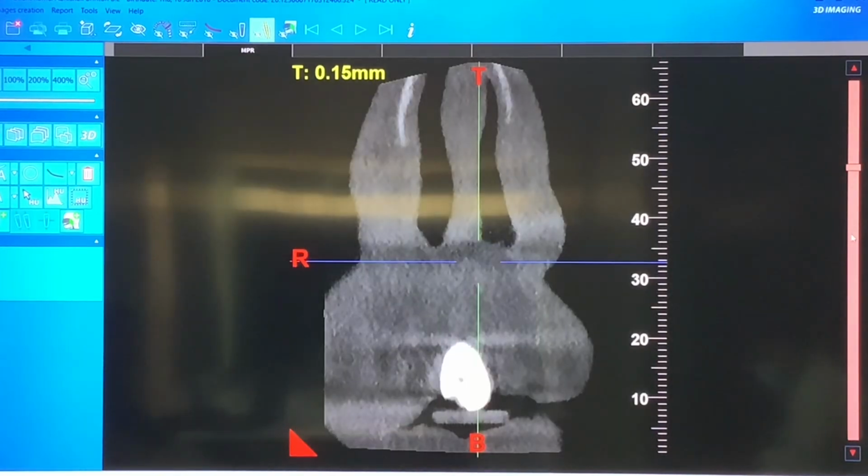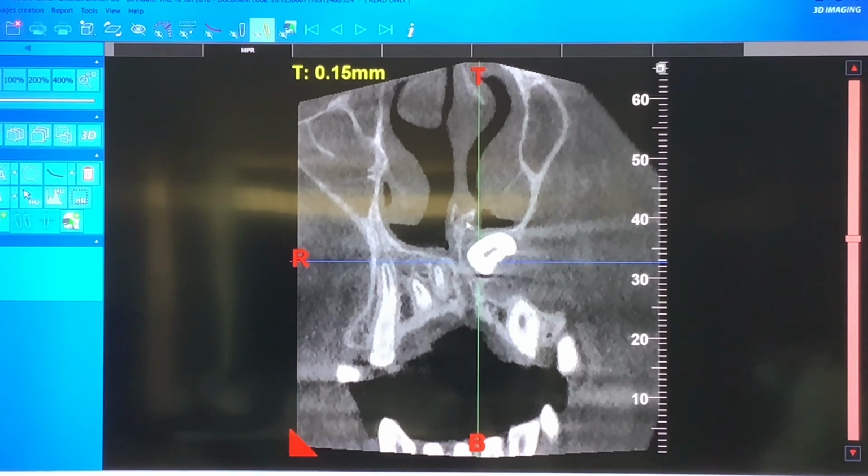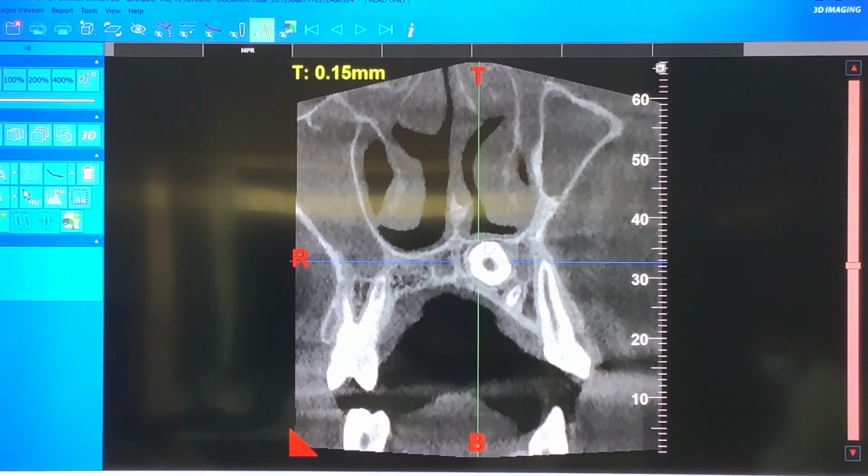You can see the left nasal floor being lifted superiorly by the impacted tooth, and you can see the root portion, which is present just below the left nasal floor. So this is an anterior-posteriorly positioned 2-1. In the coronal slice you are going through the cross section of the root, where you are just seeing the root and the root canal.